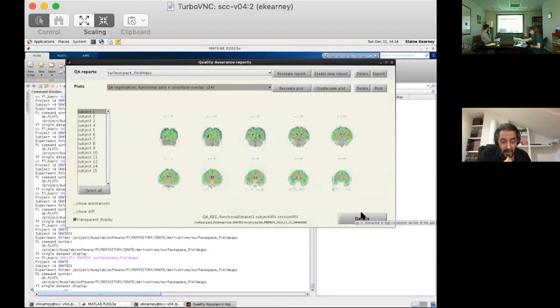So in this case, it's not particularly good, at least in the most anterior part of the brain. No, sorry, the most posterior part of the brain, right? The ones that are in the, I don't see the actual numbers, but it should be y equals some negative number probably at the very top left.